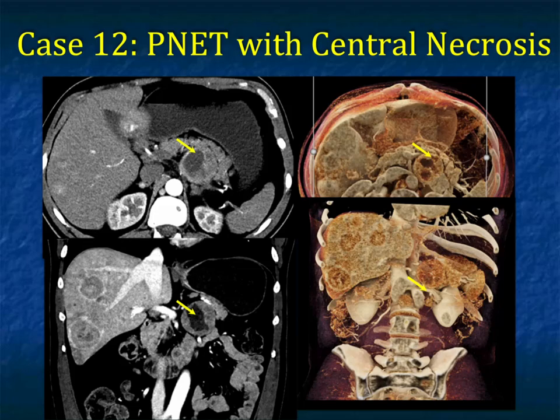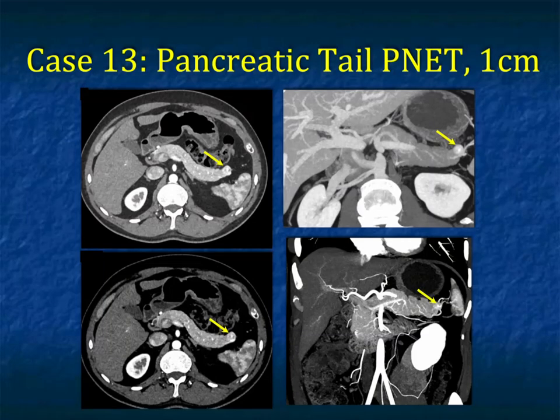Another case, here's another cystic neuroendocrine tumor. Here there's both solid and cystic components, there's wall thickening, and widespread liver metastasis as well. Again, the danger in potentially missing these, assuming they're IPMNs, can occur with the well-defined lesions, but something like this, the only question you really have is, could this be an adenocarcinoma rather than a neuroendocrine tumor? One has to admit cystic mets with rim enhancement are more likely neuroendocrine tumors.